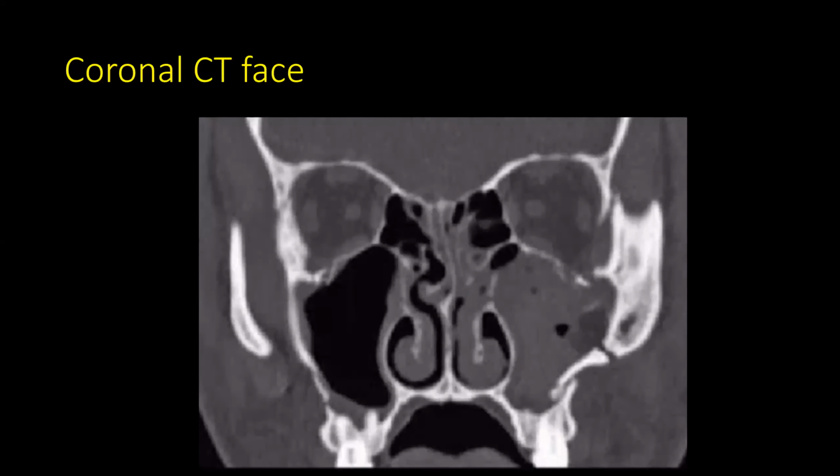again, a coronal CT at the maxillary sinus level. So what do you see now? Actually, if we were in the class, then we could discuss it better. But if you look at your normal side, on the right maxillary sinus, there is minimal mucosal thickening here, but there is nothing else, no air fluid level or sinusitis or anything else. Nasal septum is also okay. The ethmoidal cells are not opaque. A little bit of opacity is here also.